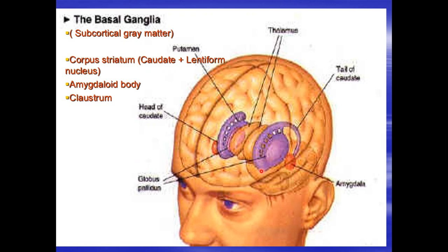This will be the head of the caudate nucleus, and it is at the floor of the lateral ventricle, and it goes within the floor of the lateral ventricle into the temporal horn. So this is all gray matter within the caudate nucleus, composed of the head that we saw in the previous images, and it goes along the body of the lateral ventricle. At the end of it, there is a rounded object called the amygdala or the amygdaloid body.